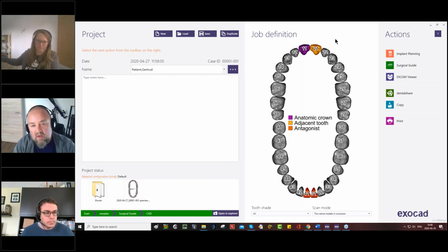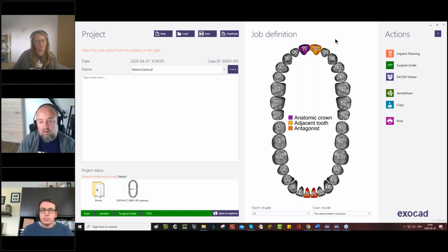What you see here in the immediate load is part of the DentalCAD, which has an add-on module, the implant module. You need the implant module to create any kind of implant restoration. It just imports the position of the implant from the planning software, compared to a normal process where you scan a scan body.